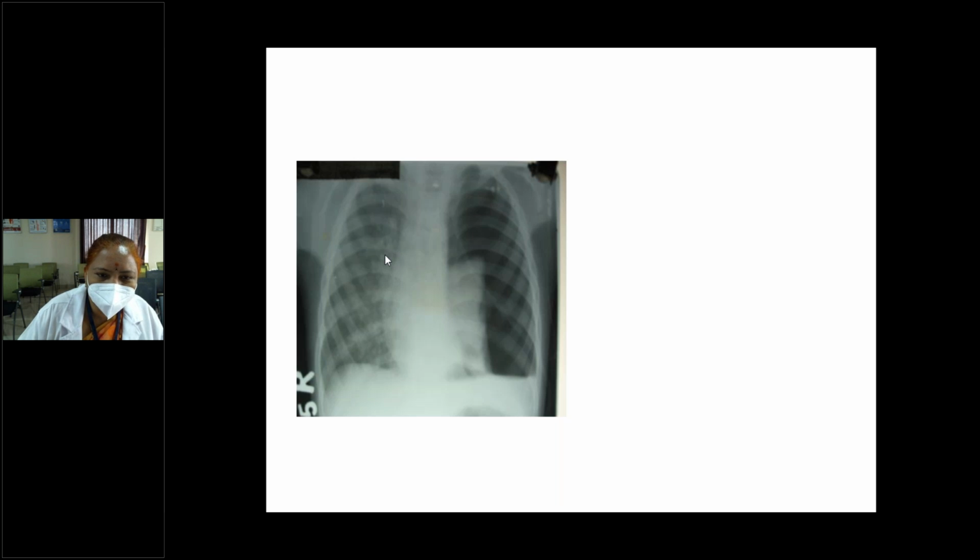What about the cardiac shadow? Is it normal? Ma'am, since the X-ray has not been taken in the centered view, the cardiac borders can't be completely commented on, but the left cardiac border seems abnormal. You are not able to delineate the left cardiac border. Cardiac border is this one. Along with this, some haziness is also there.